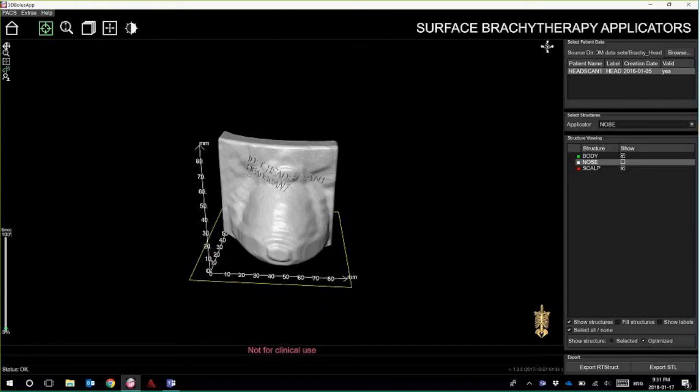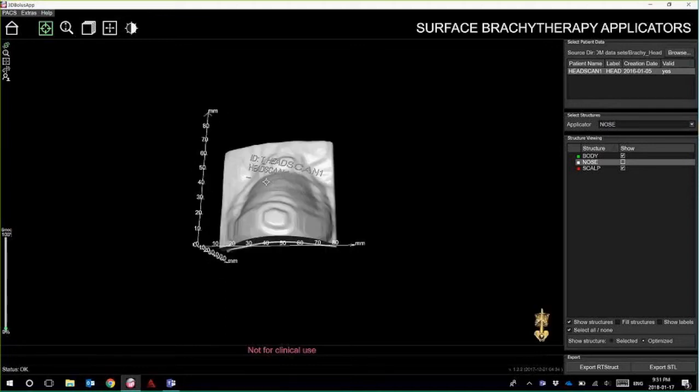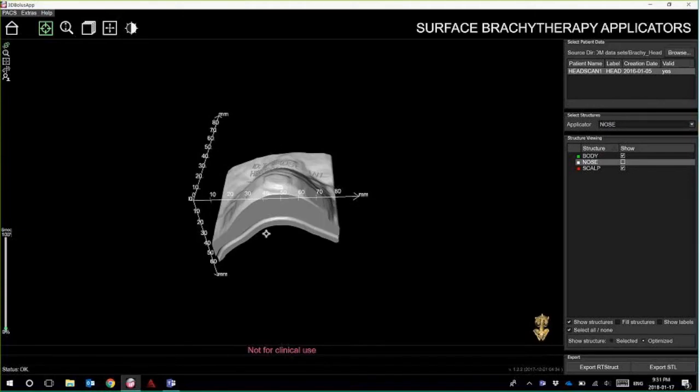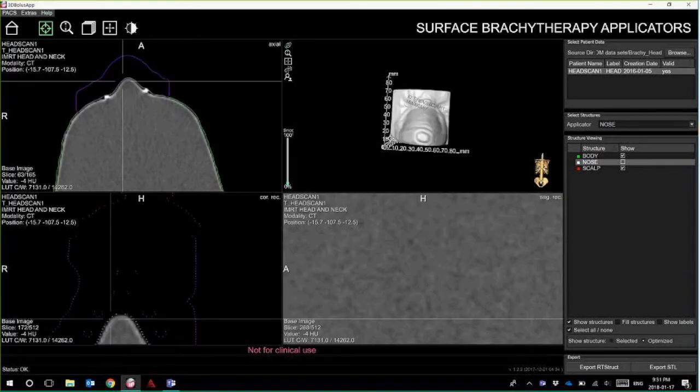We also provide a cropping plane. I'll demonstrate that very quickly. The cropping plane is used to crop the bottom of the object itself, so that you're getting that nice flat surface that's going to come in contact with your print bed, and you don't have to worry about wobbling very much. You know that's going to have nice sharp edges with a nice flat edge that's going to sit on your print bed. And then from here, it's just a simple export, and this file can be set up to print in a matter of minutes, and you can carry on with your day and have this printing in the background.